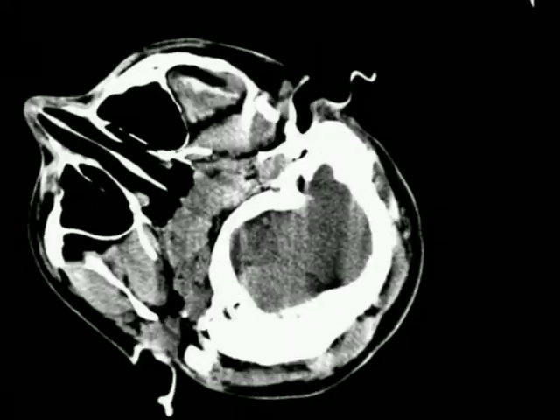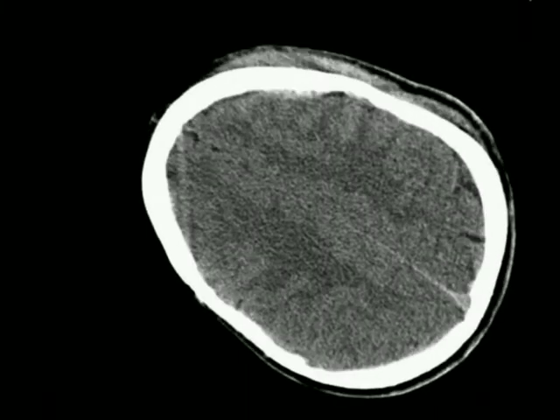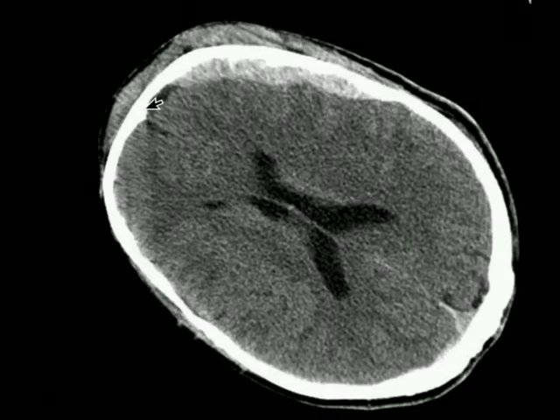To the base of the skull. So the most important things to note from this scan, as we go down from the top down to the base of the skull, first of all is this left hyperdense abnormality, which we can just see here, that follows the contours of the skull, and this represents a left frontal subdural hematoma. We've also got an overlying extracranial hematoma.